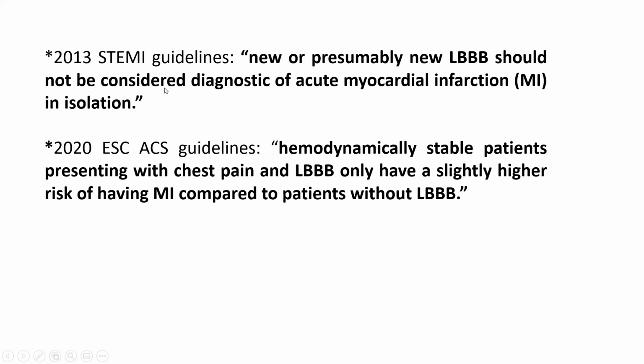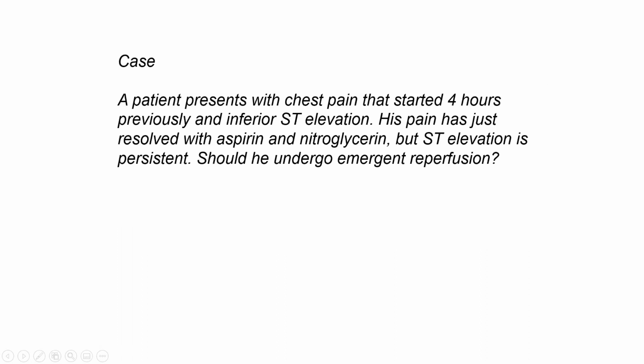In the 2013 STEMI guidelines, new or presumably new left bundle branch block should not be considered diagnostic of acute MI in isolation. So this is eliminated from an MI consideration. In the 2020 ESC guideline, a hemodynamically stable patient presenting with chest pain and left bundle branch block only has a slightly higher risk of having MI compared to a patient without left bundle branch block.